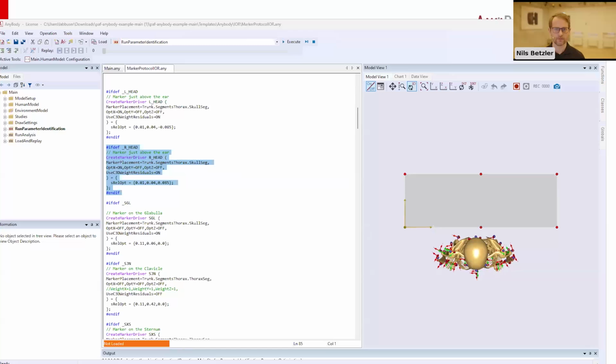Thank you. I will go back to the question list. And another question is, if I have a data set with collected data, can I use the PAF to post-process the data and import to AnyBody? So I think, if I understand right, this data has already been collected. So you are able to import the data. Instead of recording a file in QTM, you can click the button and click import, the same button that you use to record the file, and you can import them one by one. And then you can just use it for post-processing the same way.